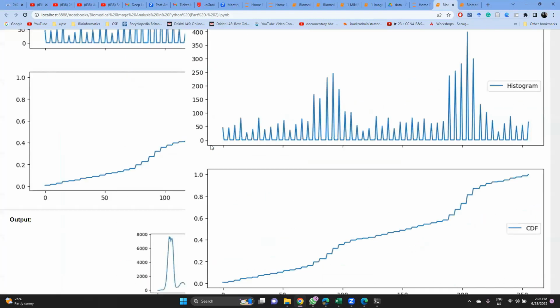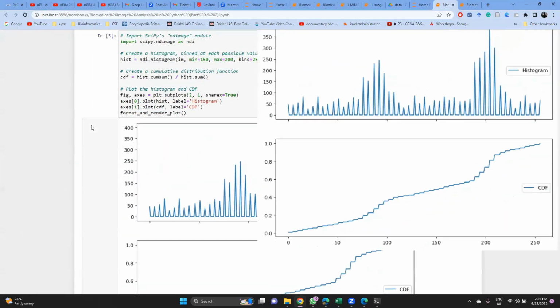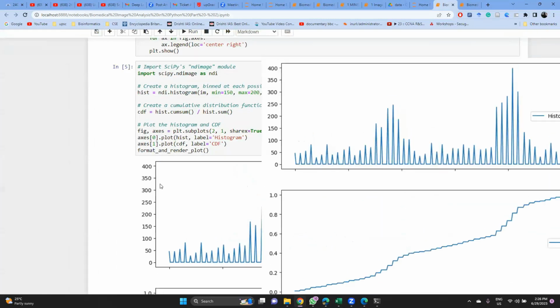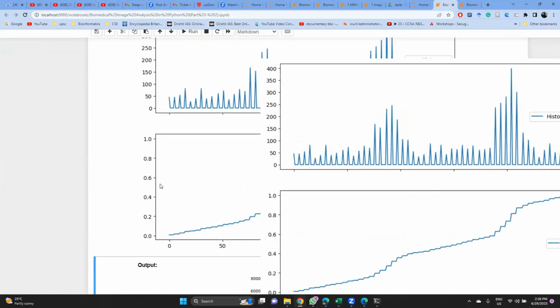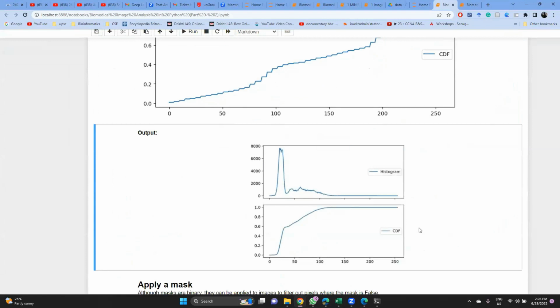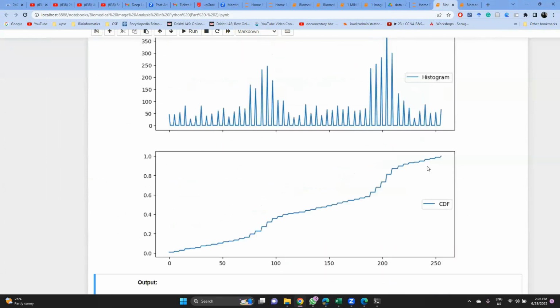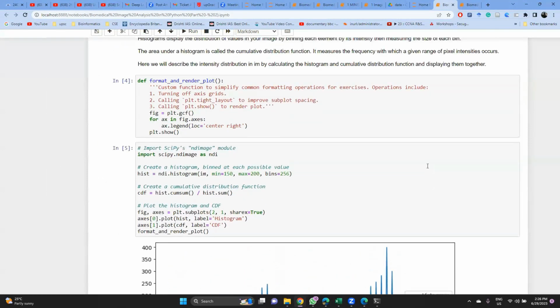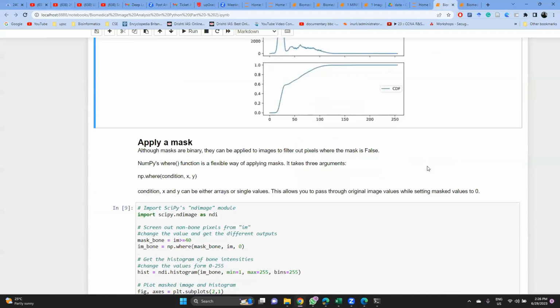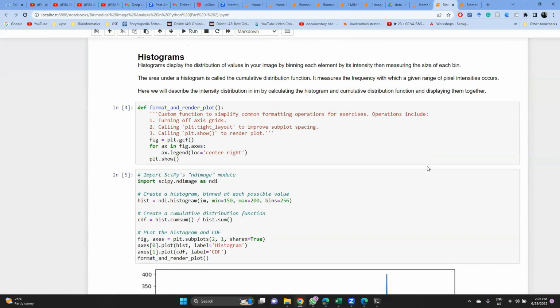So over here we can see that our values get changed. When we learn some basics of image processing, then we will know how the color distribution scheme works and how it will affect our images. So over here, the histogram. Through this histogram, we can get information related to our image, and this would really help to diagnose if there is an alteration in our image.